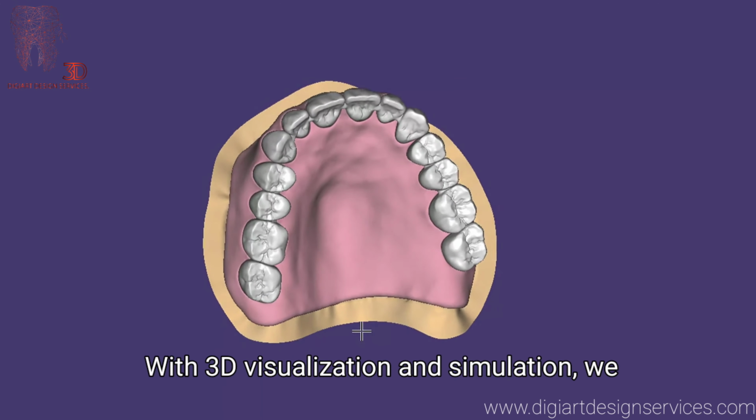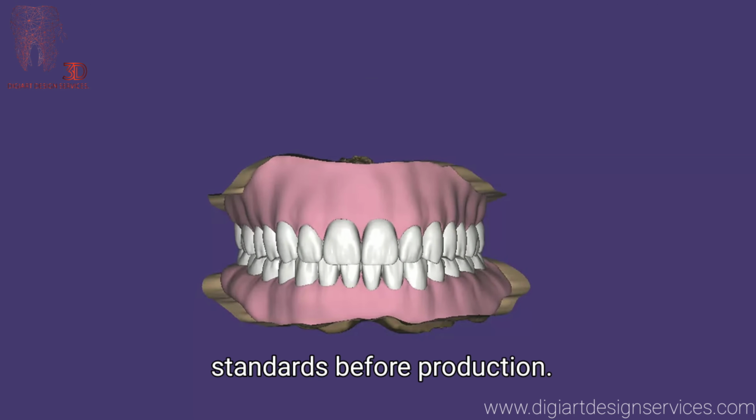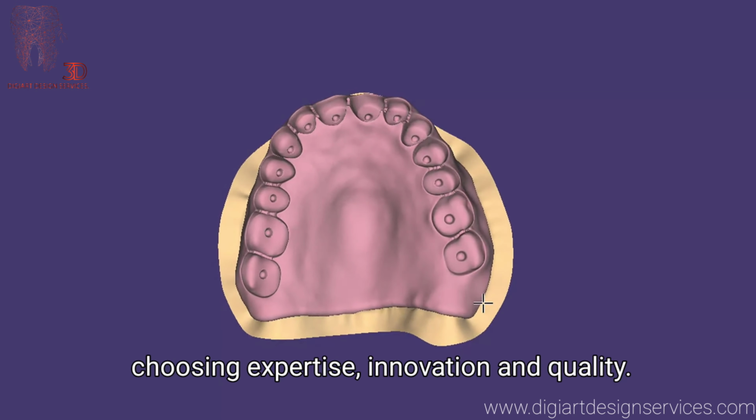With 3D visualization and simulation, we ensure every detail meets the highest standards before production. Partnering with Digiart Design Services means choosing expertise, innovation, and quality.